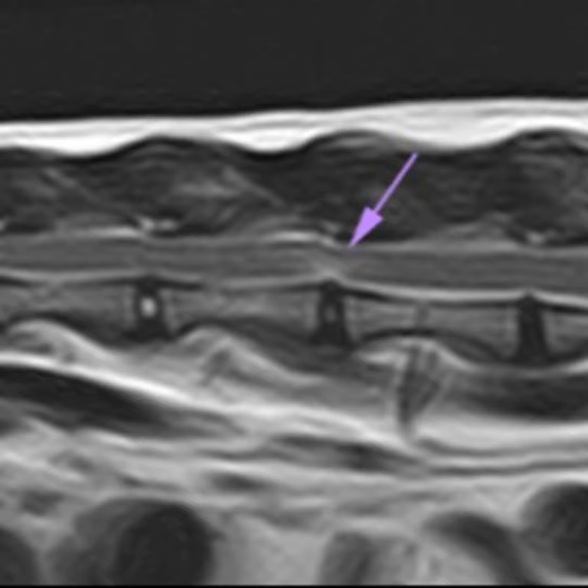Although available information about this condition has increased over the years, published evidence on disc herniation in cats remains limited. Therefore, the overall goal of our study was to determine the prevalence and characteristics of all types of disc herniation in a large population of cats referred to our hospital in a 13-year period.